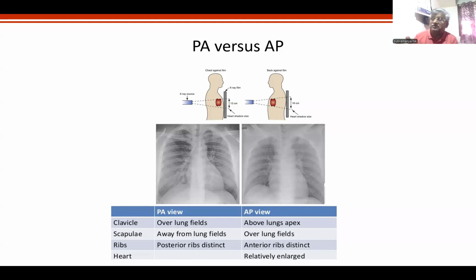One-third of the lung is really not seen, because it is behind the diaphragm, behind the heart, behind the ribs. You can't see it. So from two-thirds of the available lungs, you have to make a diagnosis of the complete three-thirds of the lung. That means the full lung has to be evaluated for the disease. And there is a radiological limitation.